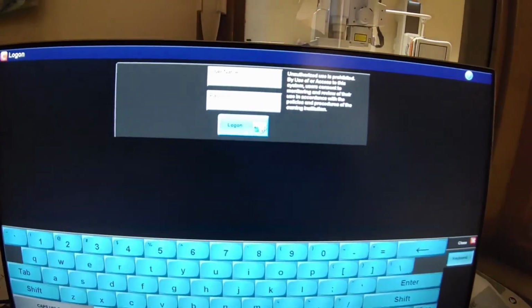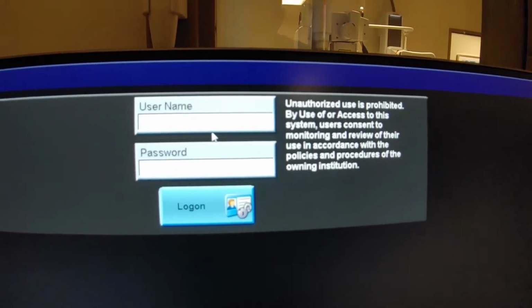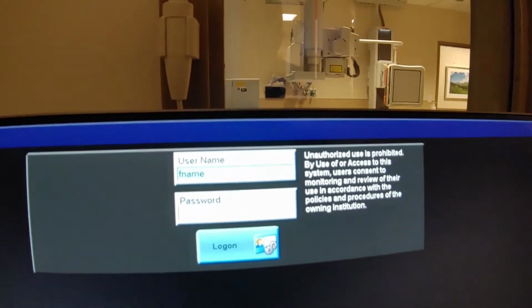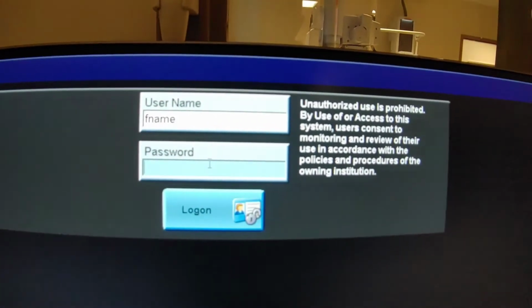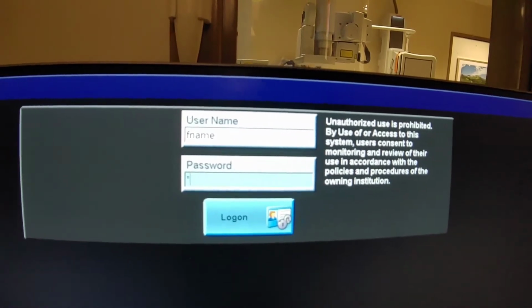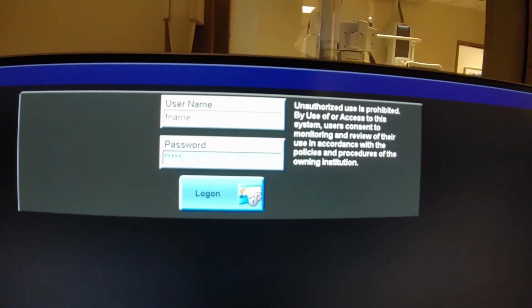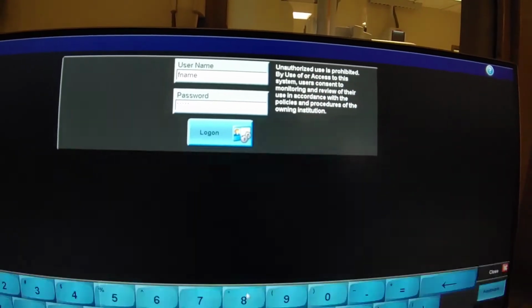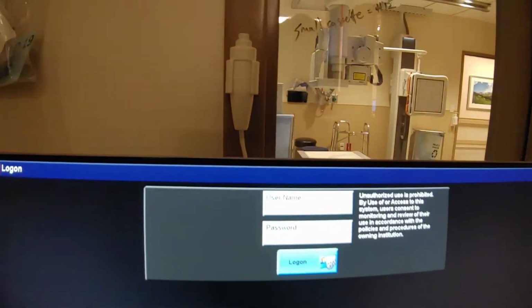Now from here, it's a little bit interesting, because what you're going to do is type in your computer ID. So for us, we did fake name, and you type that in twice. You put it both on the username line and the password line, because after we do this, it's going to recognize our username and prompt us to create a password, if you're not a dummy or spell things wrong like I just did. Let's try that again, but this time I'll actually watch the keyboard.